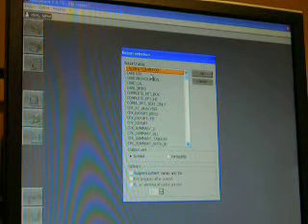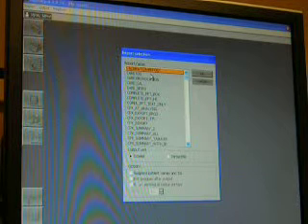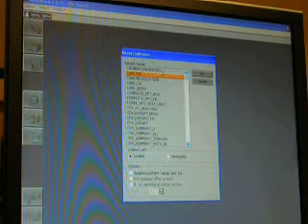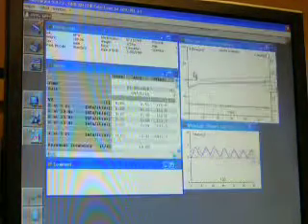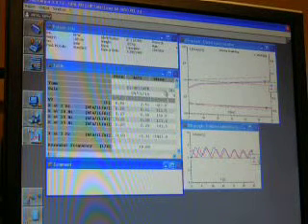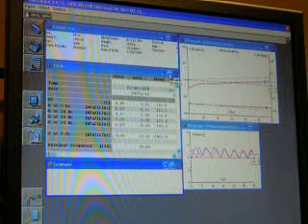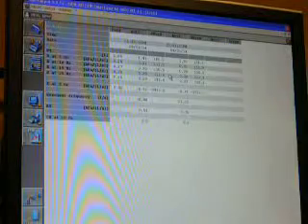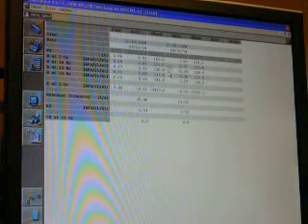And today we're going to use the CARE IOS. I think we'll probably have our own IOS report loaded onto the systems at your site. Click OK. And now here are all the values. These are the values that we're interested in, and we can expand this screen by clicking on the maximize icon there at the top. And we can take a look at the values.